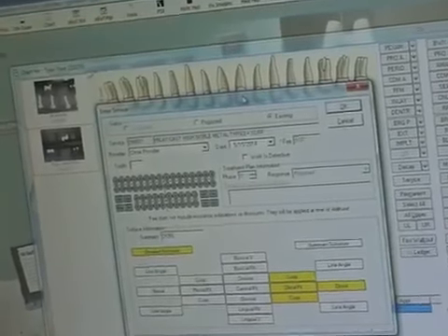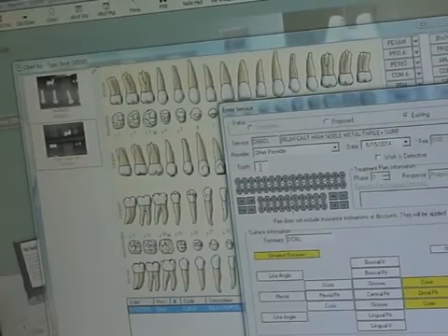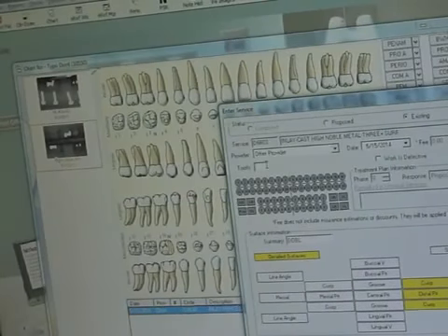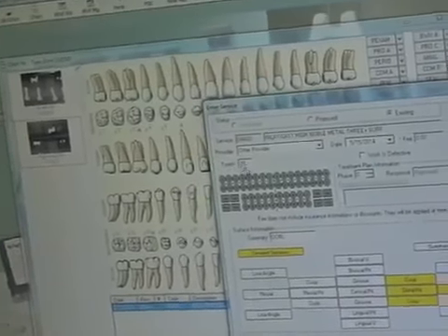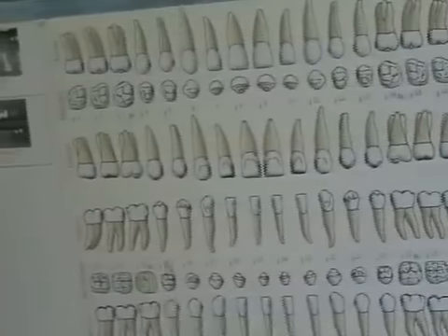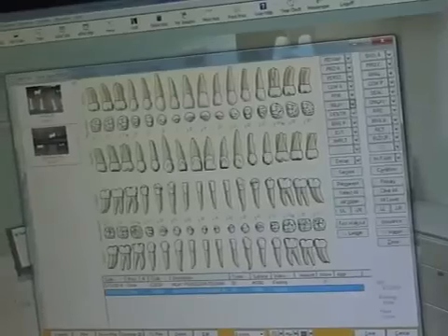If that happens and there is a tooth missing and you do not have the tooth highlighted, you may type in the tooth number that it presents on in the tooth number box. Then you may hit OK. It will then highlight the area that the inlay is on.